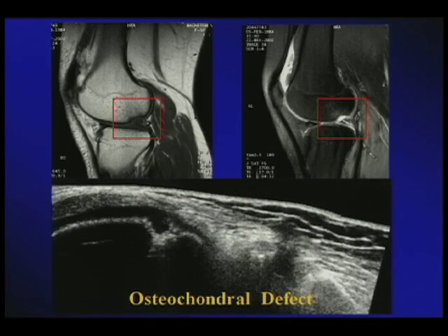And on ultrasound, again, with a posterior acoustic window, you now appreciate the fact that while on MRI, you could not completely characterize the cartilage cap over this defect, on ultrasound, you begin to appreciate that the hypoechoic curvilinear cap over the subchondral defect is now trying to regenerate.